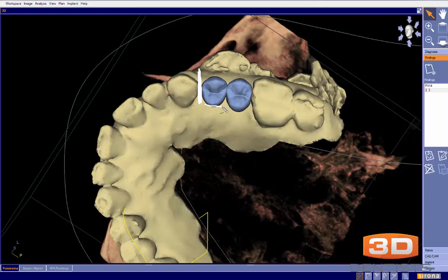Also, in taking a look, the buccolingual width of the two teeth are quite different. One is smaller than the other, and I'm not certain that that is accurate there as well. Again, you're talking to a stickler here about these things. So again, I just would like to see these things a little bit more accurate. We can't plan very well without having the accurate data there.